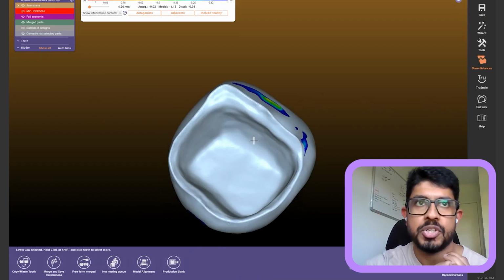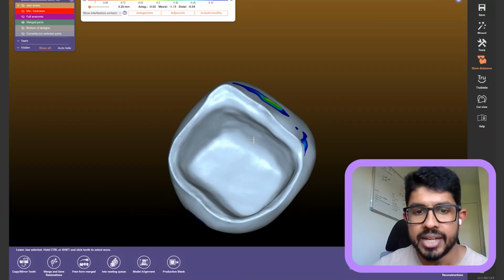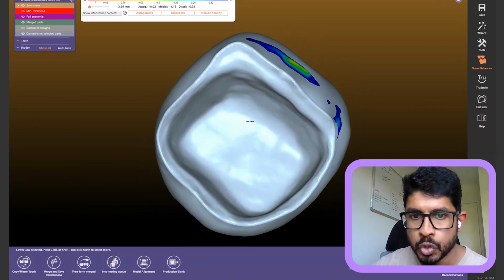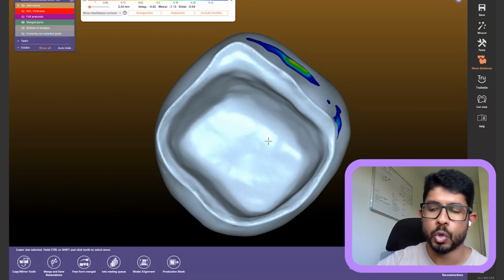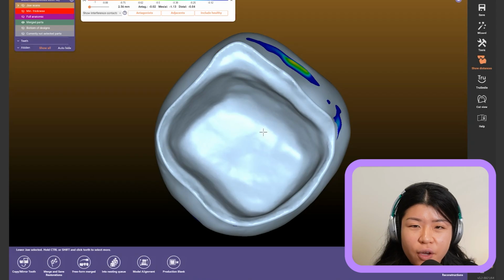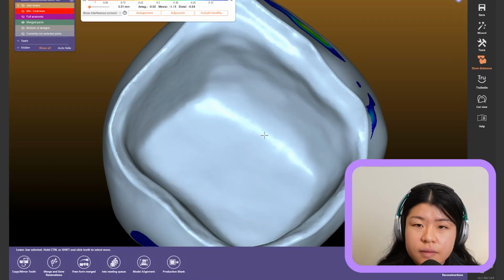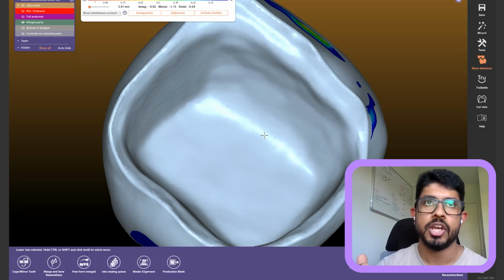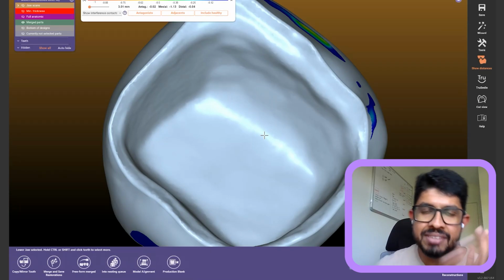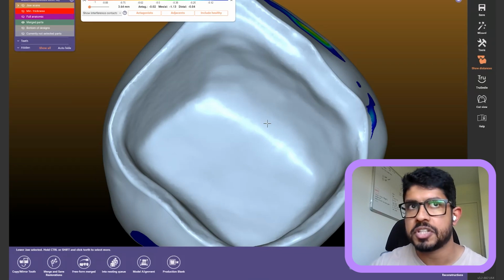With a CEREC milling machine, something is automatic in terms of how it is milled. If you've designed and milled in CEREC, you will notice that if you look at the undersurface of the crown, there are little burr holes or burr indentations in there. Have you seen that? I've seen that, where they've over milled those areas, right? Exactly. And that's intentional by CEREC, because they want you to overmill those areas so that you can have a much better fit. I would rather they have that than have a tight fit, and then somebody has to check if the fit of it is too tight.